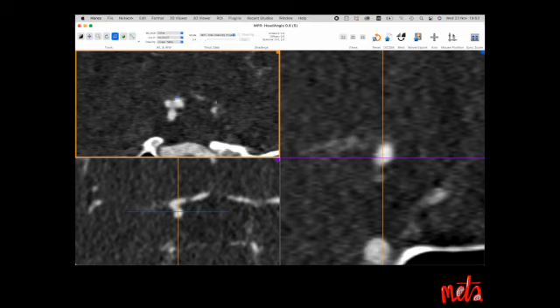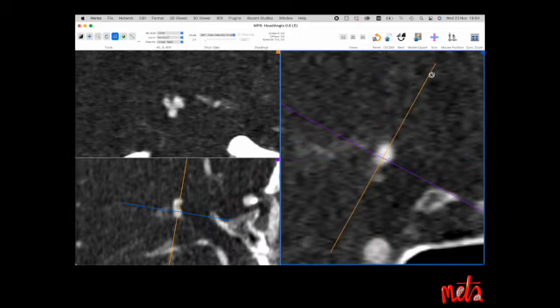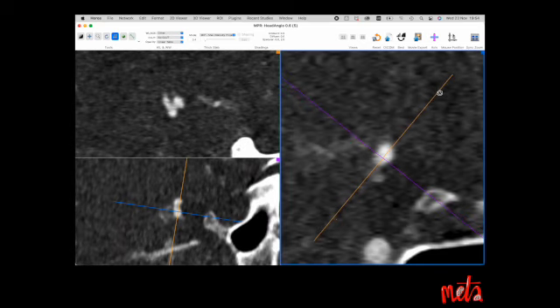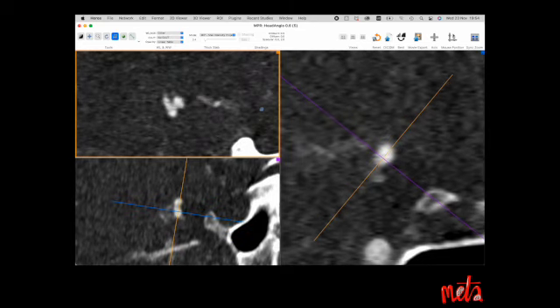You could see earlier that the anterior temporal aneurysm that we have just measured was quite regular. This posterior communicating artery aneurysm is quite irregular in shape, and initially it looked quite wide-necked, but by performing the manipulation and rotation of the image, you can see that it is actually quite narrow-necked, which is important because that means it's likely amenable to endovascular treatment.